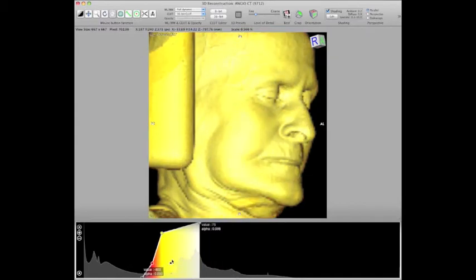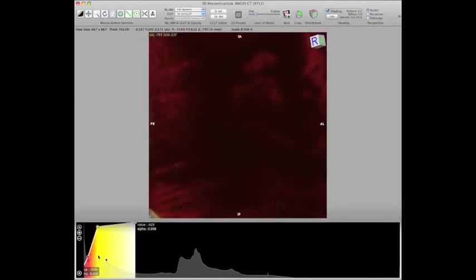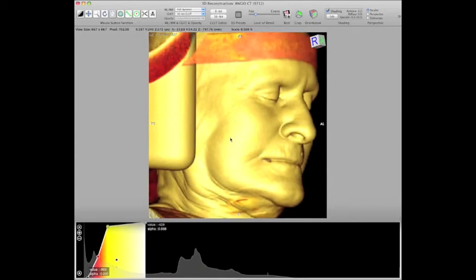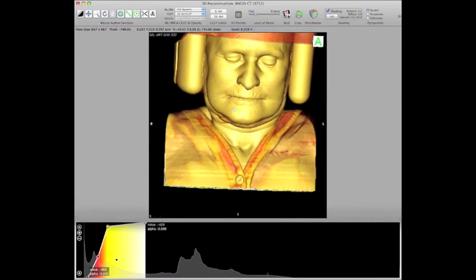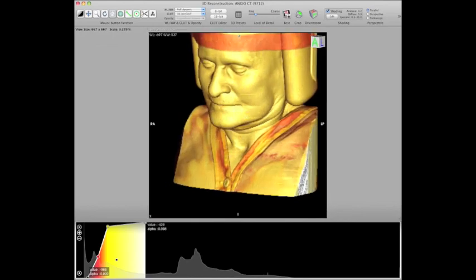And if we keep going, we'll even pick up the foam cushion on the outside of her head, and then eventually we'll pick up the air. And lastly, the little bit of tape they put on her forehead to hold her in place during the scan, right? And her gown. And the button on her gown. And I'll finish this up in the next demo.